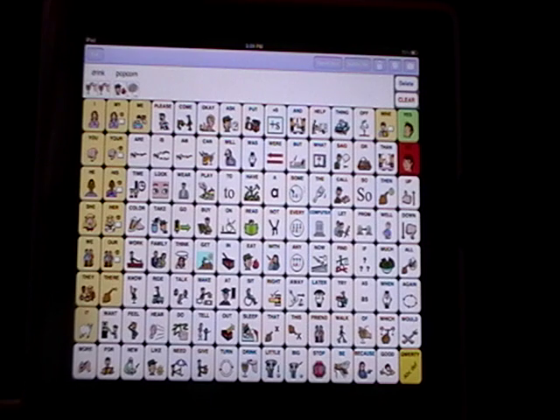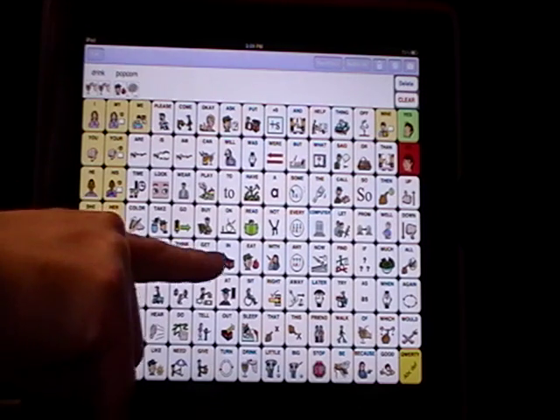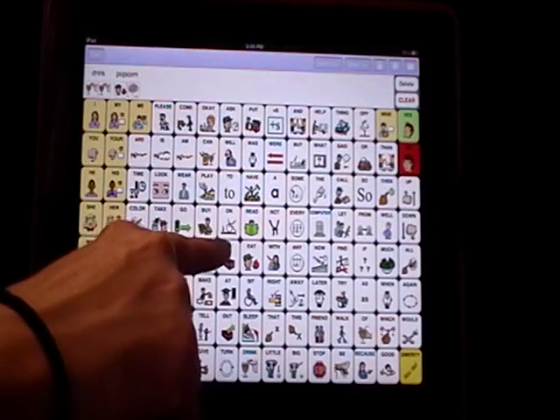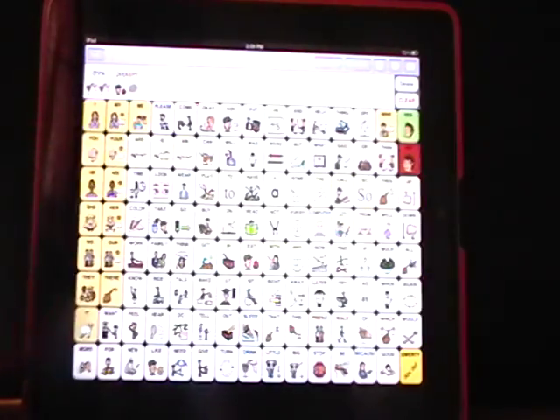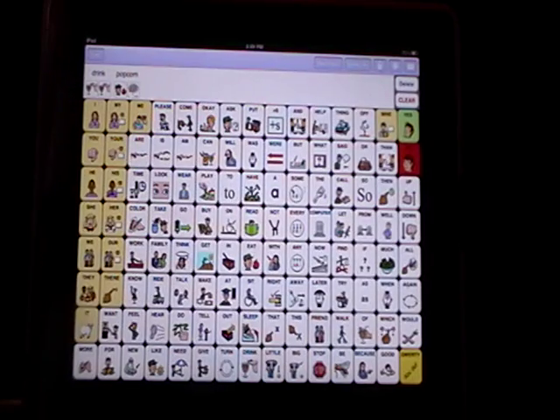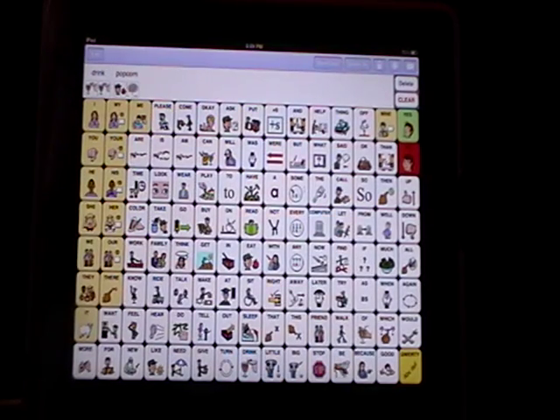The way that we did this is there are almost 5,000 pre-programmed words in here. It has the capacity to hold 14,000 words. So each of these words can link to another page with empty cells that can be customized. So you can put in whatever you'd like there, and we'll go over editing in a little bit.